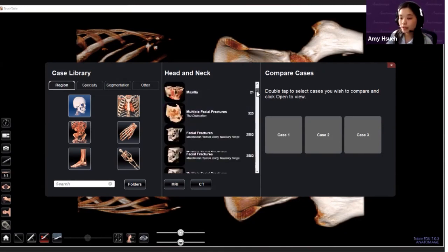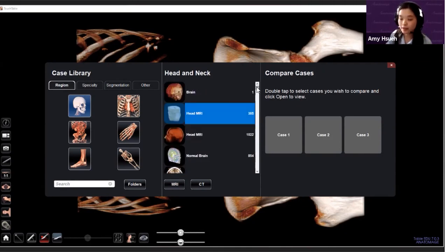So if you're at your table, then you could go and look at the case library list and see which case names happen to pop out at you. And once you find a name that you particularly like, then you could go to the case library description PDF, search for that case, and then read the description.